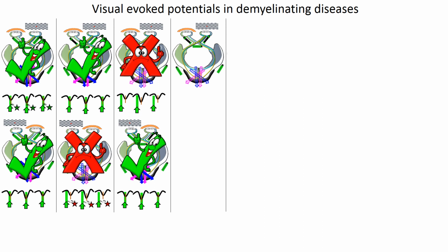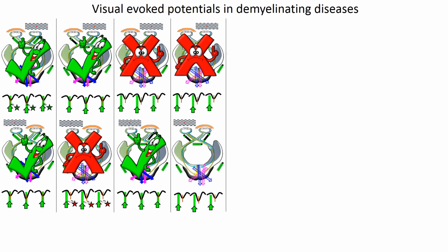The newly introduced figure in the fourth column depicts the delay vector resulting from right visual field testing in a patient with bilateral optic nerve disease. That is bilateral demyelinating optic nerve disease. Thus it would be abnormal. And the same thing will occur when the left eye is tested, since the left optic nerve is also demyelinated. Those vectors will be delayed, and so will be the P100s arising from them. So the left visual evoked potential study will also be abnormal.